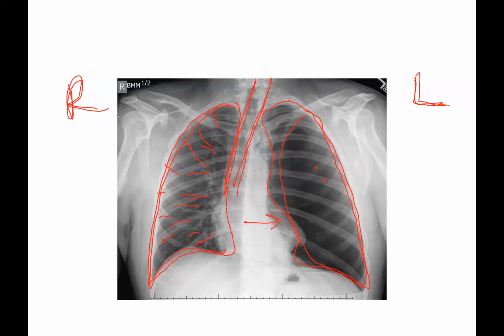Because the diaphragm on the affected side is moving downward, and there is a mediastinal shift to the contralateral side, and I think there are fractured anterior ribs. I'm not sure. What are the features of tension pneumothorax? You look for them. You mentioned two, you have one more.